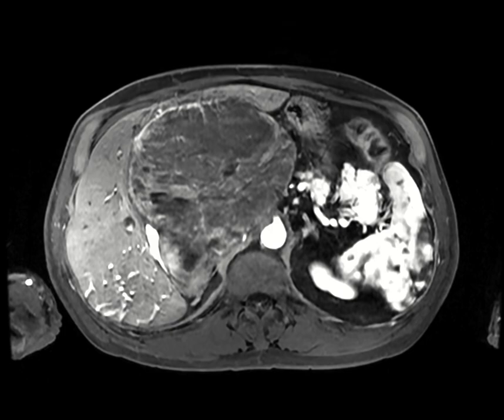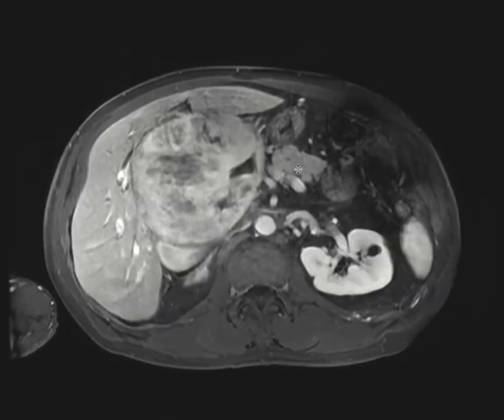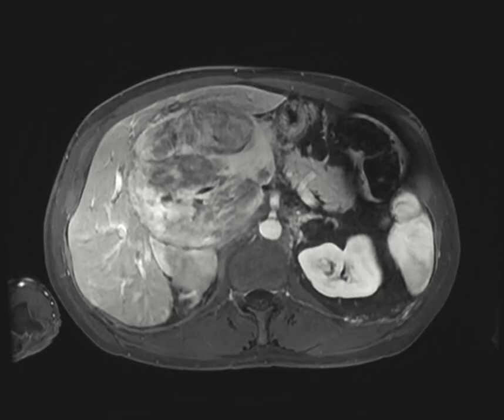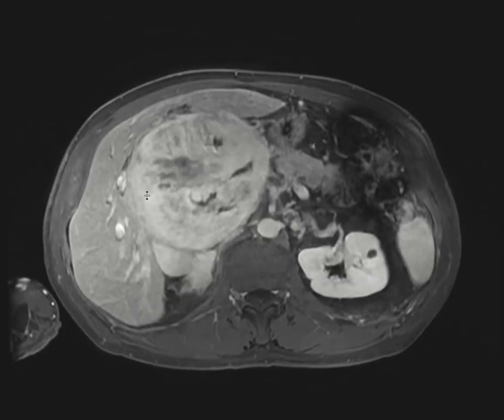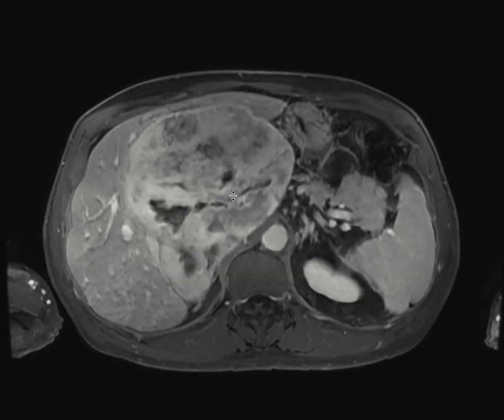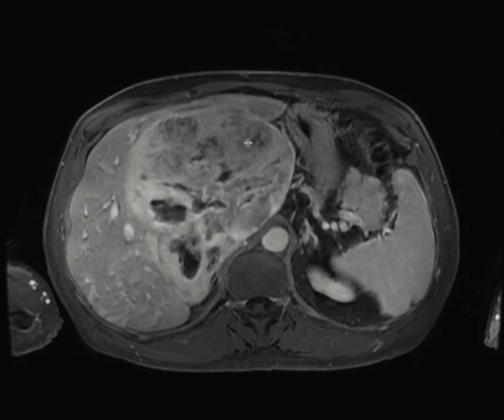And as we progress through to the portal venous phase, we can see that there's increased enhancement on the portal venous phase, and on the more delayed phase, we can see there's even more enhancement there. And so this has characteristics of a tumor in which you have areas of necrosis, but you have also arterial enhancement that has persistent enhancement on delayed phases, and in fact becomes more intense, has more uptake of contrast on the more delayed phases.